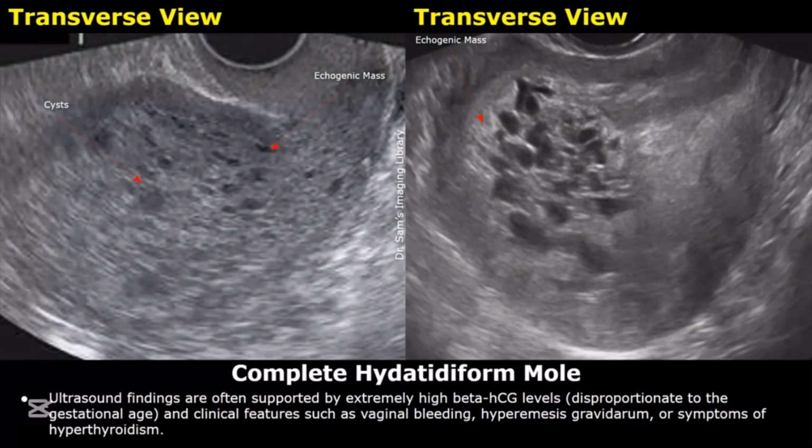A complete hydatidiform mole, or a complete molar pregnancy, is the most common type of gestational trophoblastic disease. In this condition, no embryo is formed and no fetal parts are seen. Instead, the uterus is filled with an abnormal benign mass.